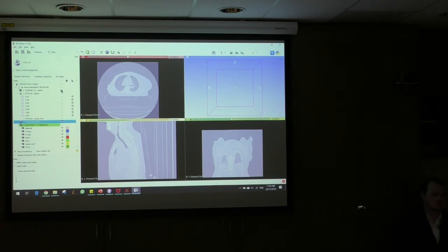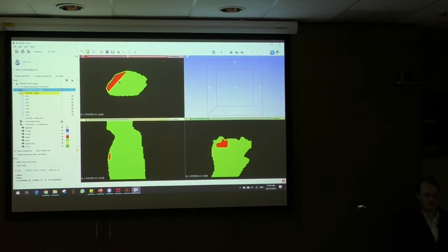Yep. And with the RT dose, there's your RT dose profile, and it does actually change the corresponding value down the bottom here. So it's no longer using the CT density; it's using RT dose in the form of grey. And again, this is based on Slicer's own internal configuration. It's not necessarily a direct visual from your treatment planning software. So it will be close enough, but yeah, when you're dealing with a patient, I wouldn't recommend using the slicer because, again, you have to commission it. Yeah, so you can see the dose there is changing. So we're at 0.8 around there, and here it's about 41.